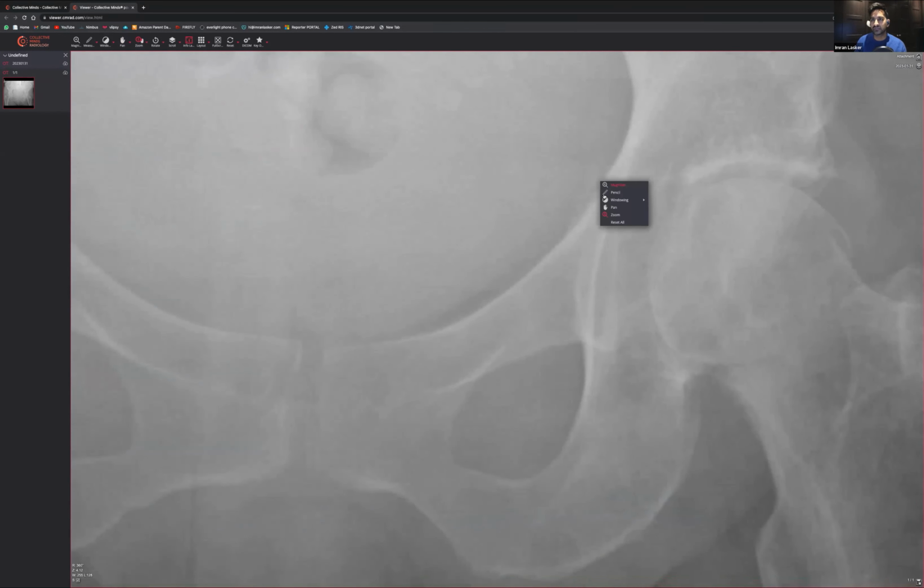But the final thing I'd also really highly encourage you guys to do is to have a look at this area over here. And just make sure that this is all very, very smooth all the way along, right? Because sometimes when someone has such an impacted fracture, if they've got dodgy bones, it can actually fracture the acetabulum. What do I think about the contour of the inferior iliac spine on the left?